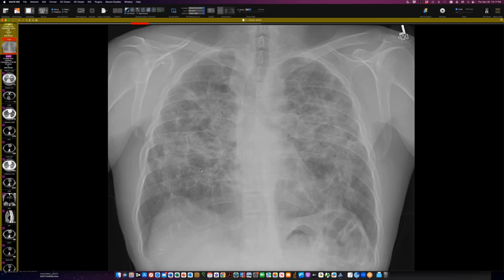Okay, and here's a case of a person with lots of lung disease and lots of distortion. Here you can see the traction on the inferior accessory fissure causing juxtaphrenic peaks on both sides, reflecting upper lung volume loss. Pretty symmetrical pattern, very low lung volume here.